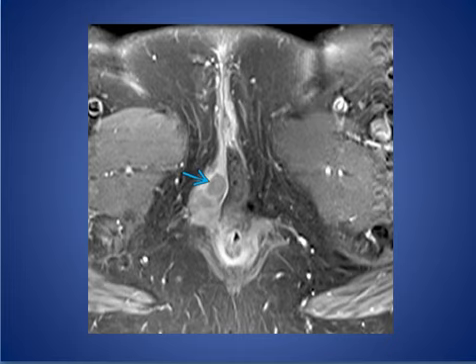This is another patient. This is T1 weighted images after contrast, and we have a cyst here, intermediate signal intensity on the right side of the vaginal introitus. The lesion shows thin wall enhancement but no enhancement of its content. Pus was aspirated from the cyst, consistent with a Bartholin abscess.